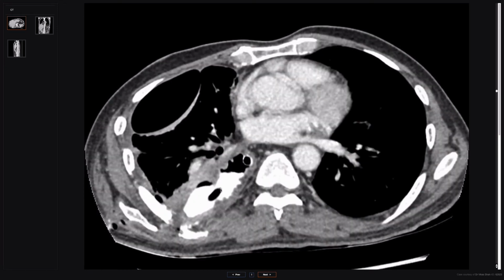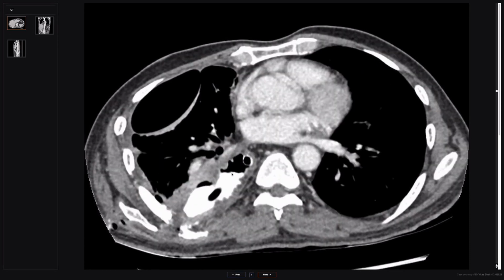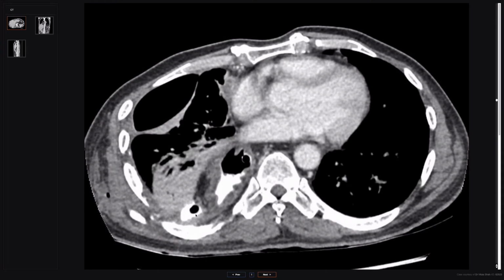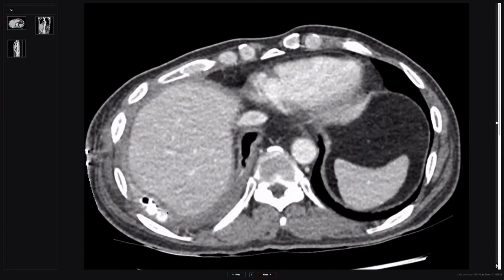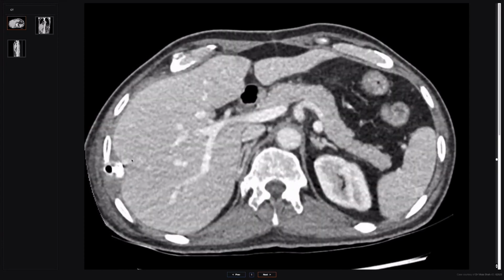So they've got a pretty wide open leak from the posterior wall of the pull-up into the lumen. Okay, and the contrast in this follow-up confirms for us that there is an ongoing leak, that this is not sealed up. The contrast has come out of the lumen of the pull-up into this collection, which is tracking all the way alongside the drain to where the drain comes out of the patient's body.